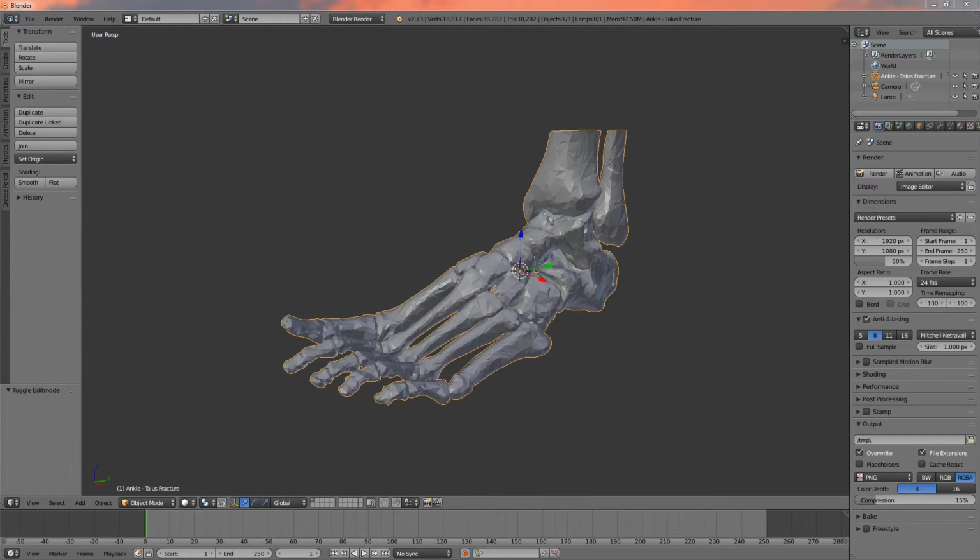Now, I've been doing 3D printing of anatomic models for about 3 years now, and it took me a lot of time to figure out this trick, so I hope that you'll find this very helpful. Repairing all of these mesh defects is going to be really quite time consuming. It can't be done automatically, and repairing them manually is going to be quite difficult just because of the number of these problems. So the solution to this has been to not repair them.